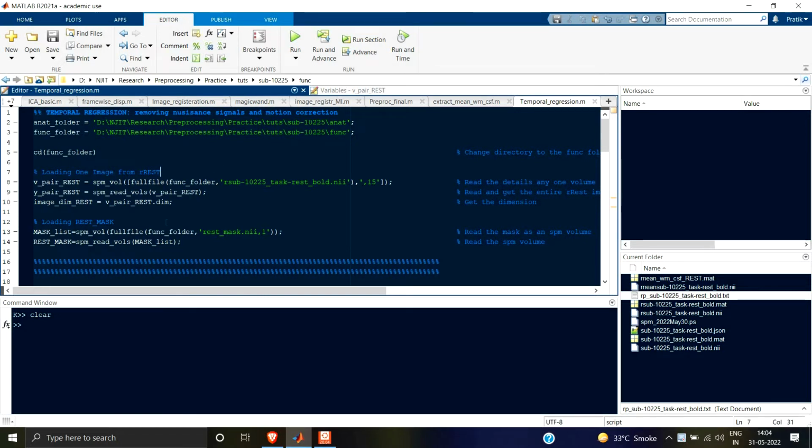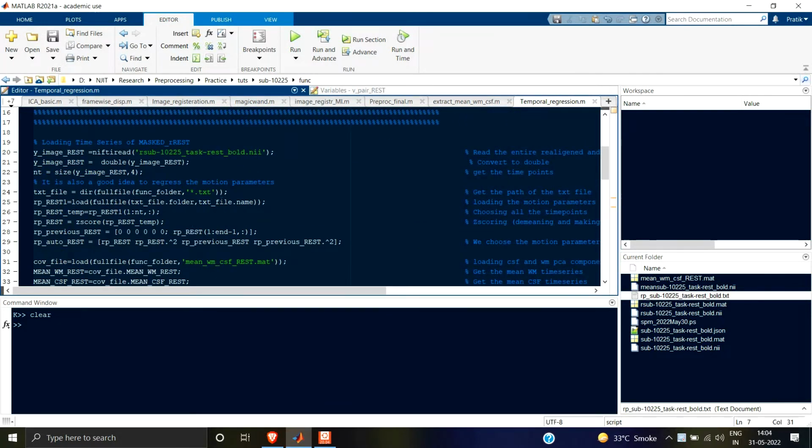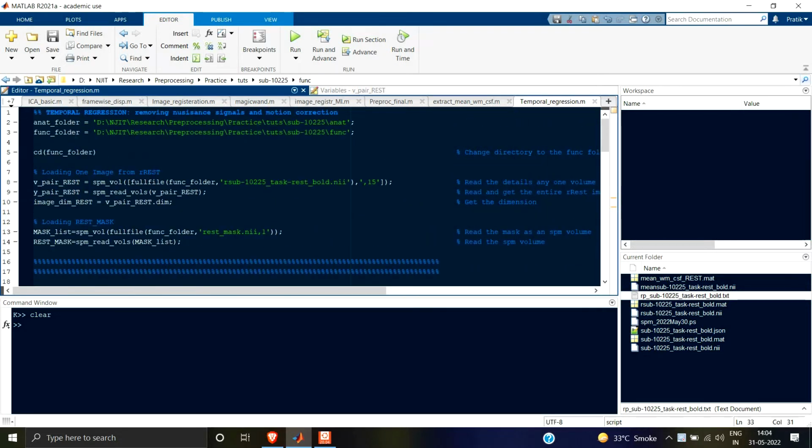In the previous video we saw how we could extract the mean white matter and CSF time series. Now we are going to use these mean CSF and white matter time series to regress out the signals that are in the brain, the time points in the brain. That is what we are going to do today.